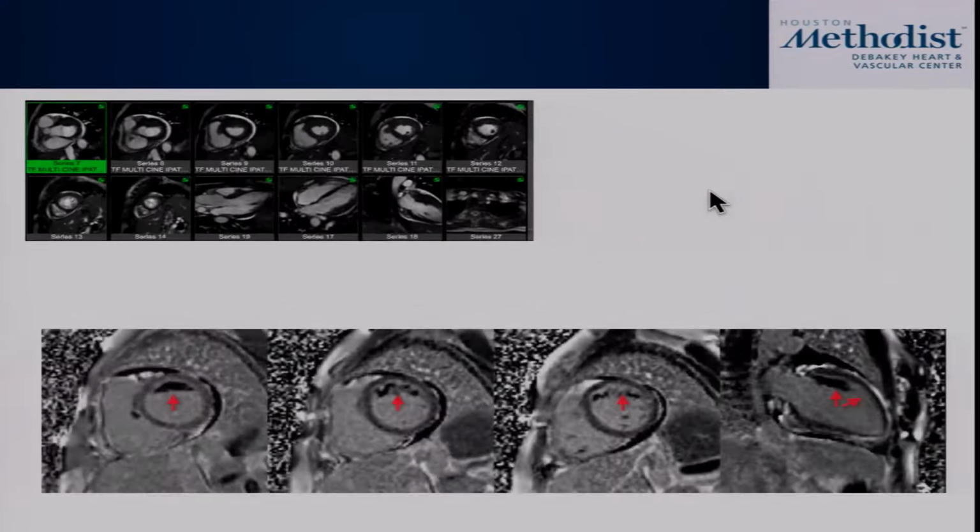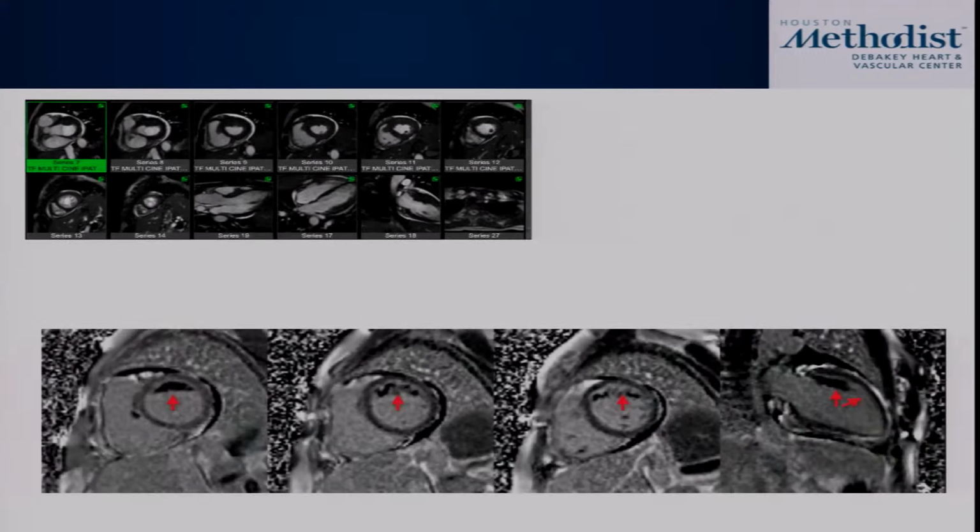Okay, now I'm going to show you the delayed enhancement MRI. And again, this is maybe for the MRI fellows. Some of this is also pattern recognition. What do you see? Describe the pattern, and then we'll talk about what this suggests. So one of the MRI fellows want to take this? Yeah, Hussam? Yeah, so it seems like there's an area of LGE, but within that area, there's an area of non-enhancement, the area in black.